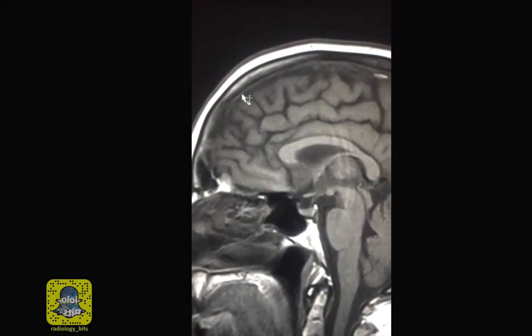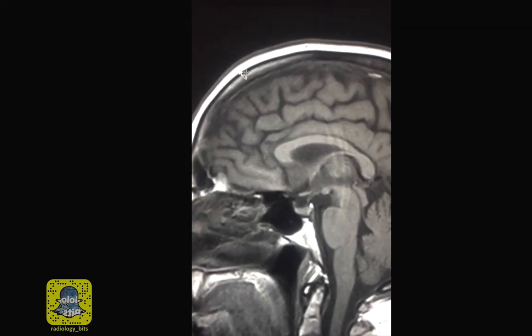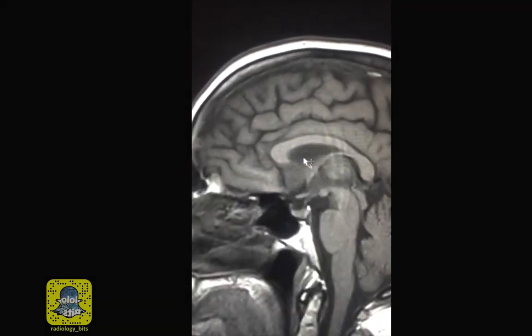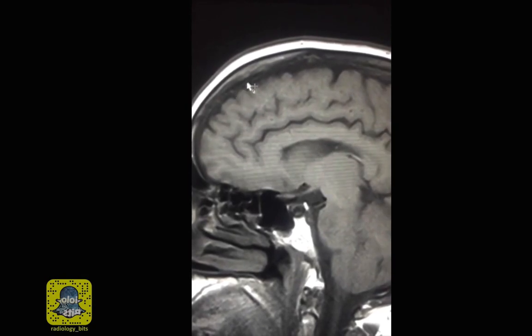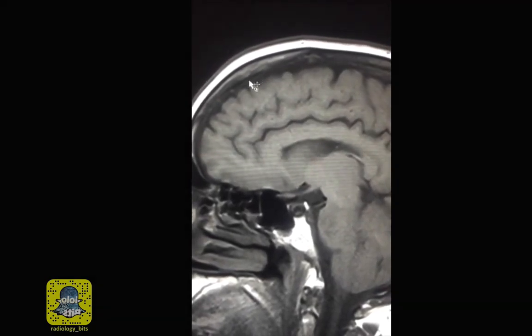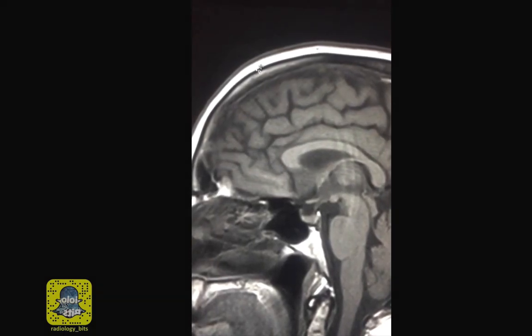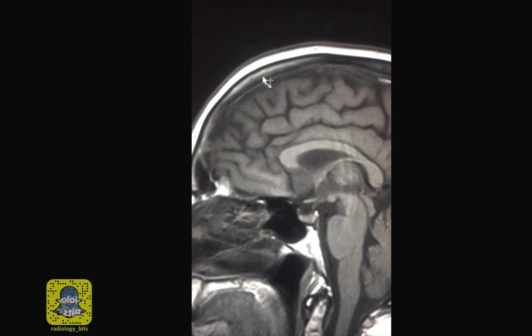Just a little bit of anatomy. This is the subcutaneous tissue with bright fat. We agreed that fat is bright on T1. We also agreed that the CSF fluid is dark on T1, such as the CSF space you see here. So what's between the CSF here and the subcutaneous tissue there is actually the bone of the skull.